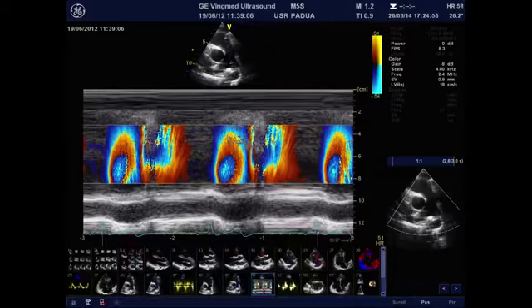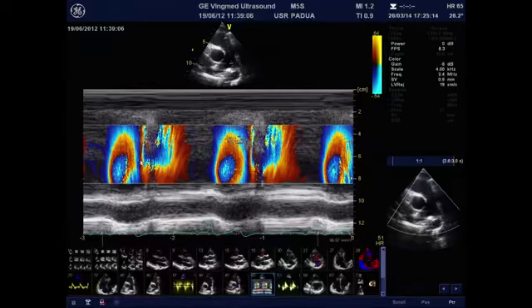As you can see here, the flow in diastole is red, and its duration is marked by this image here, while during the late diastole there is no color flow, meaning that there is no regurgitation, and we can measure the ratio between the duration of regurgitation and the entire duration of the diastole. Alternatively, this can be done also with continuous wave Doppler imaging.